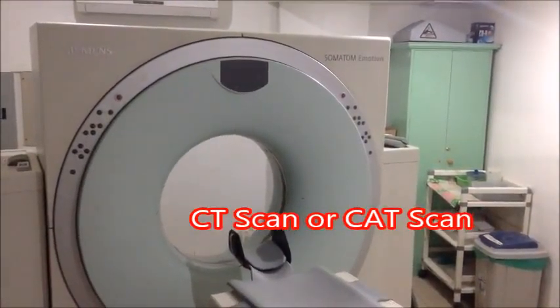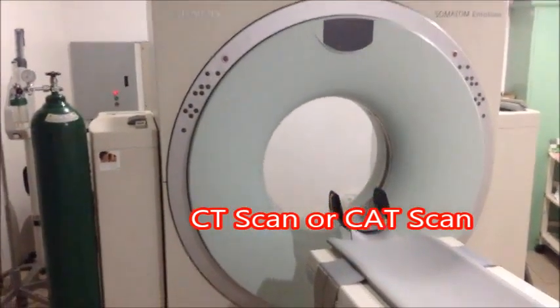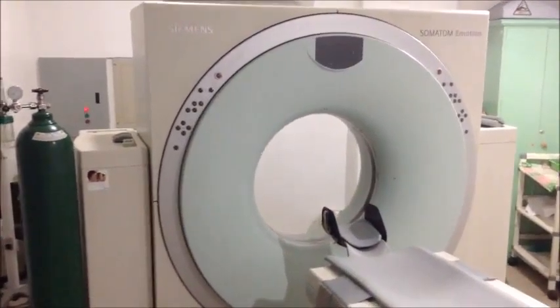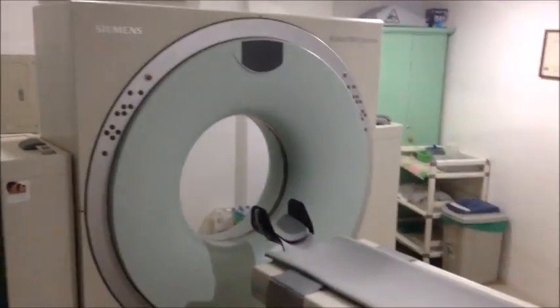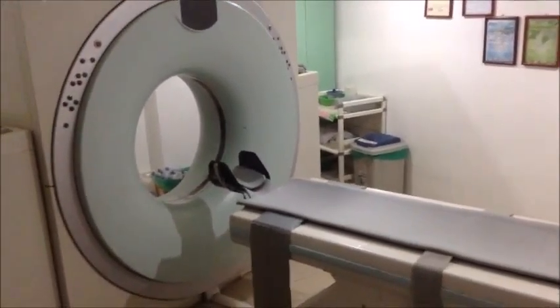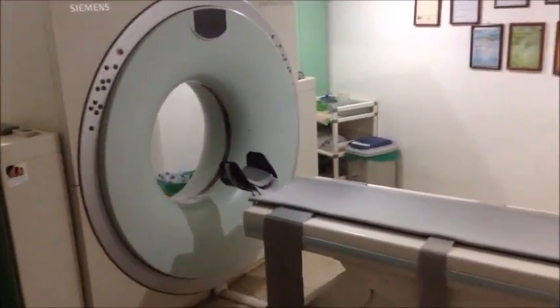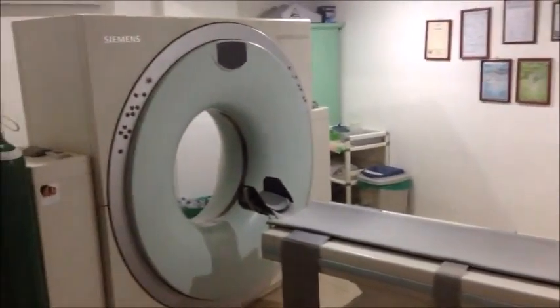CT scan is an X-ray procedure that combines many X-ray images with the aid of a computer to generate cross-sectional views and, if needed, three-dimensional images of the internal organs and structures of the body. CT is more commonly known by its abbreviated name CT scan or CAT scan.